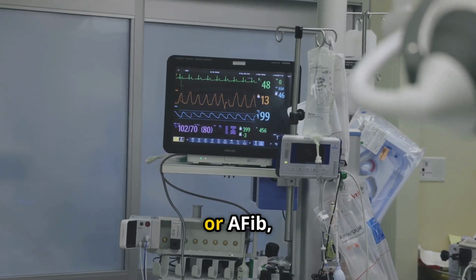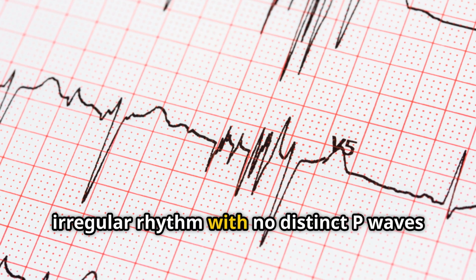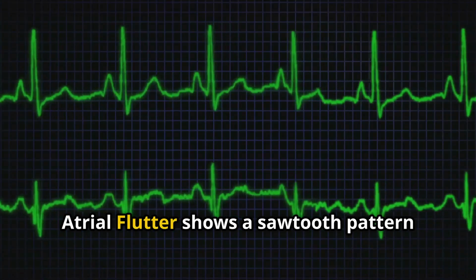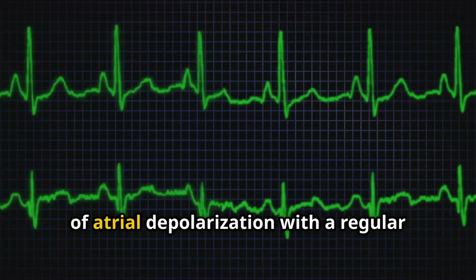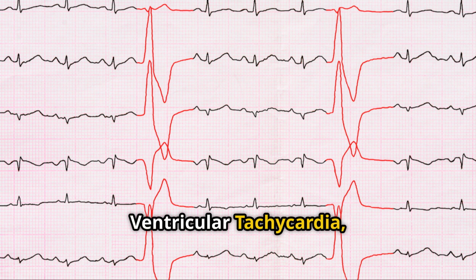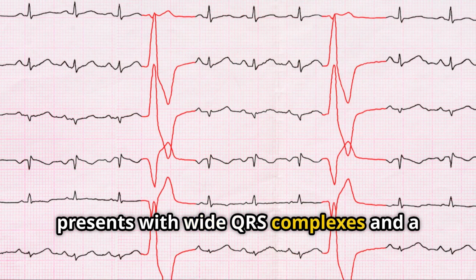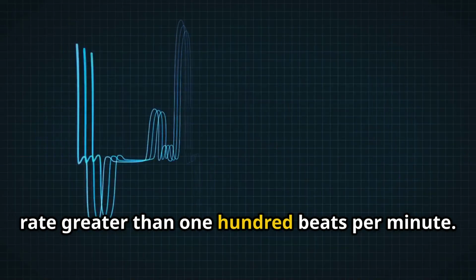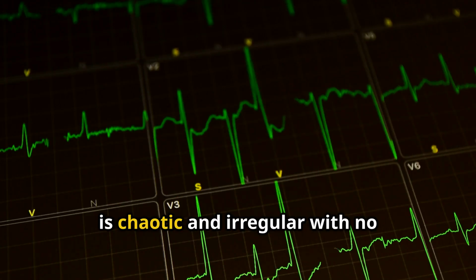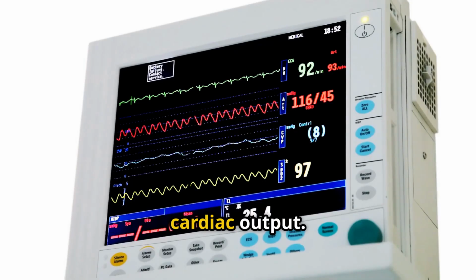Atrial fibrillation, or AFib, is characterized by an irregular rhythm with no distinct P waves and a rapid ventricular rate. Atrial flutter shows a sawtooth pattern of atrial depolarization with a regular ventricular rhythm. Ventricular tachycardia, or VTach, presents with wide QRS complexes and a rate greater than 100 beats per minute. Ventricular fibrillation, or VFib, is chaotic and irregular, with no identifiable waves and no effective cardiac output.